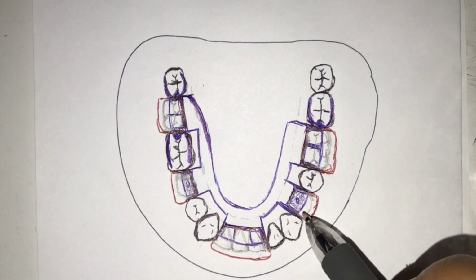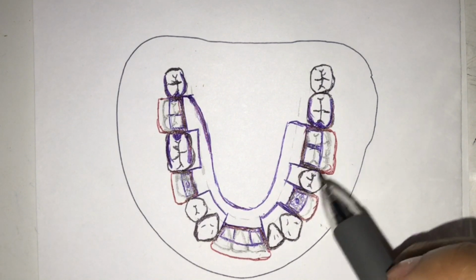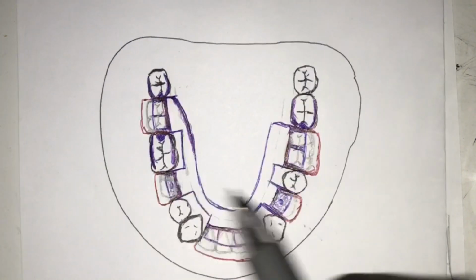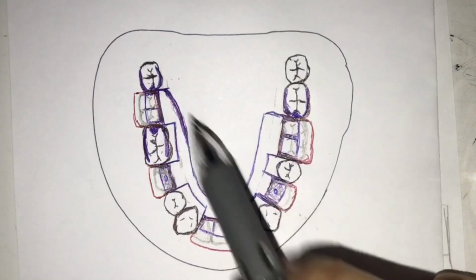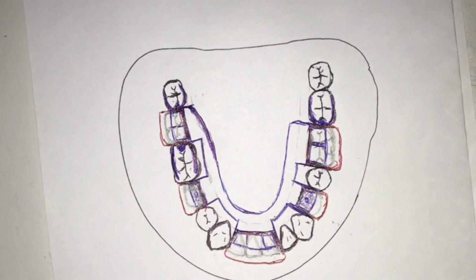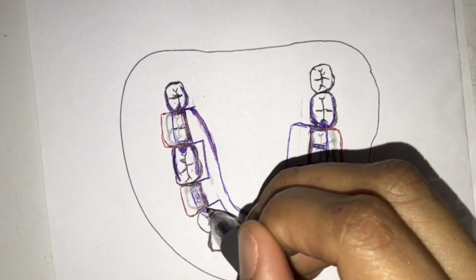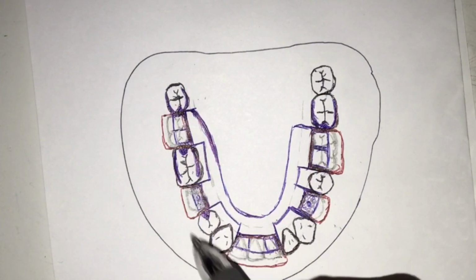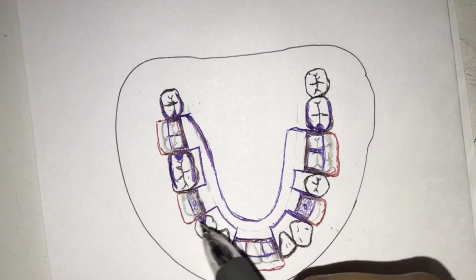An incisal rest too would just lever, unless it's necessary and you have no other supporting structures. But if you'd like additional support, although 3 is already the minimum, you may opt to add a rest in this premolar. It's just fine. And when you add the rest, you do not really need to place a direct retainer. It's not really that indicated.